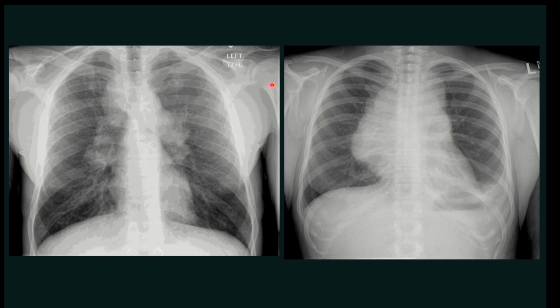What is the difference? The only difference is the lobulations, or the garland pattern, what we are commonly used to. This garland or flower-like pattern, because you see a flower, there is a thread, you see a flower, again there is a thread. So it gives a garland-like sign, hence it is called Garland sign. It appears like a garland.